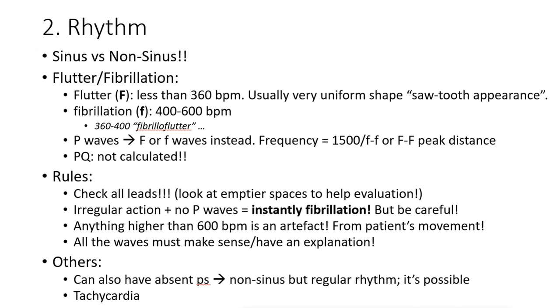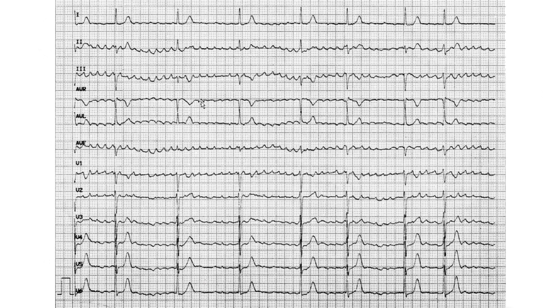Yeah, everything's okay. So, going back, this is the first example, and you can pause for a bit, and if you like, you can try, based on what you know, to make all of your observations based on those 10 steps, and then come back, okay? You can have a few seconds.